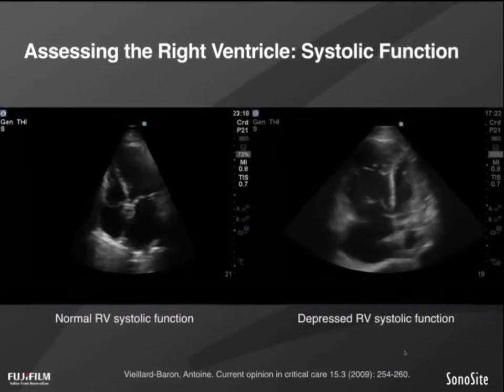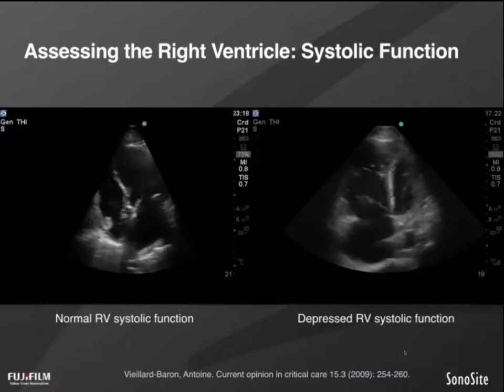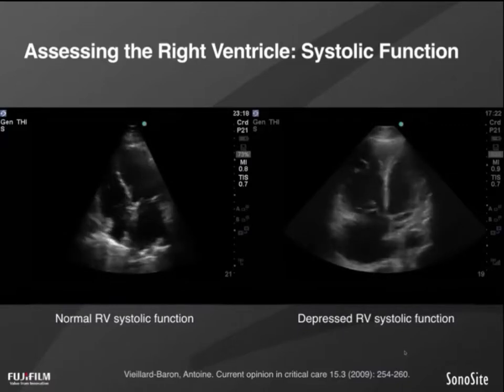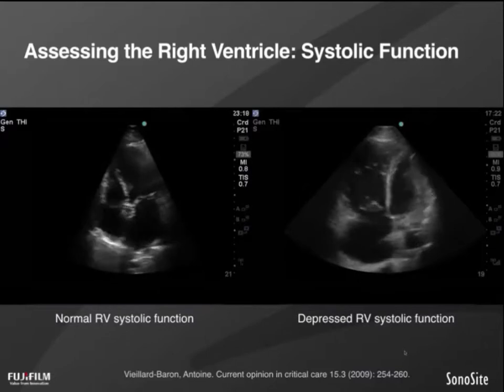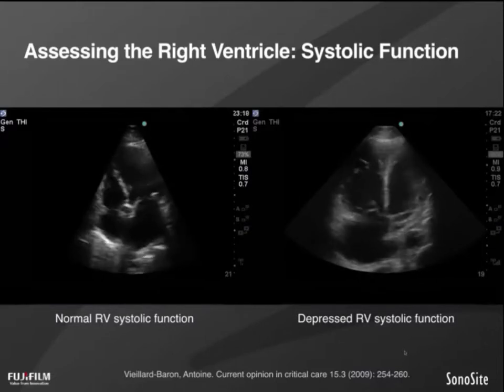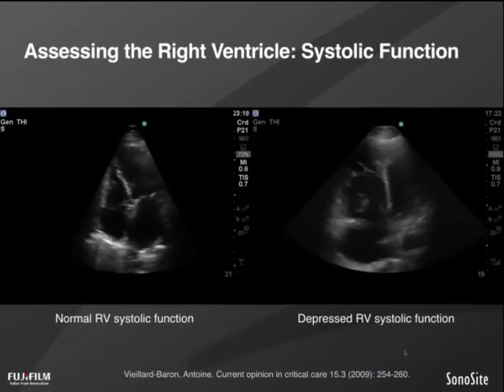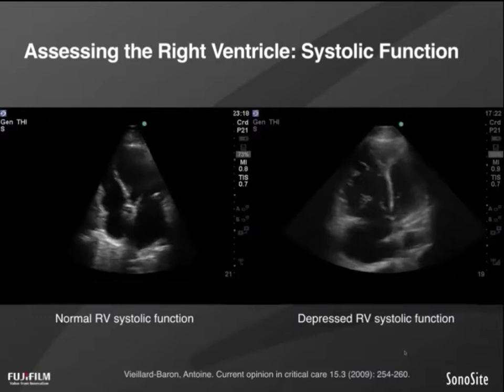So we've now reviewed that a failed right ventricle is a dilated right ventricle, and that with progressive phases of right ventricular dysfunction, the septum will become progressively disordered in its kinetics, eventually arriving at a D-shaped left ventricle when both pressure and volume overload have taken over the right ventricle.